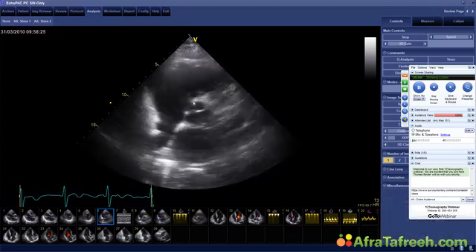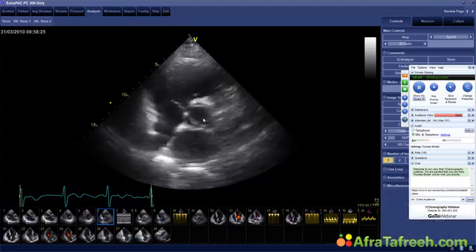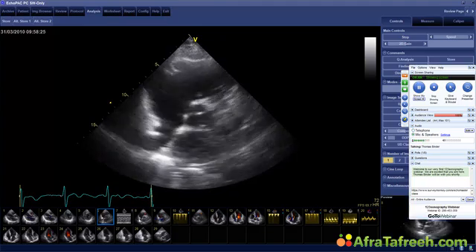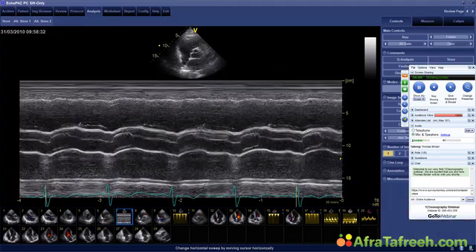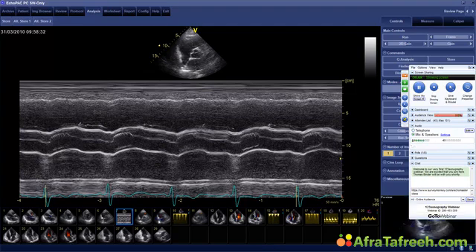This is the aortic valve. Here you would estimate if the valve opens or not. Here's an M mode across the aortic valve. Remember, this is the box that opens during systole. This is the left atrium, the right ventricular outflow tract, and the ascending aorta. See if you can see anything abnormal here.